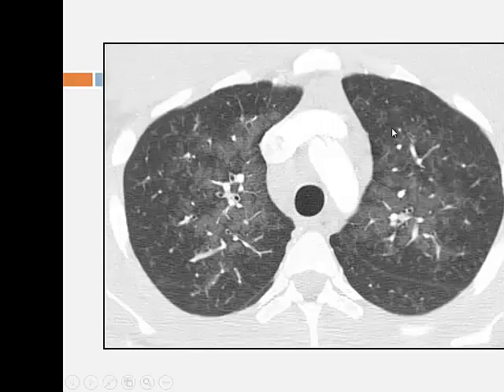So this is the kind of mosaic attenuation. You might dismiss this as chronic thromboembolic disease. This was actually veno-occlusive disease. So it can mimic primary pulmonary arterial hypertension, which makes it a bit tricky. So sometimes these patients end up having biopsies.